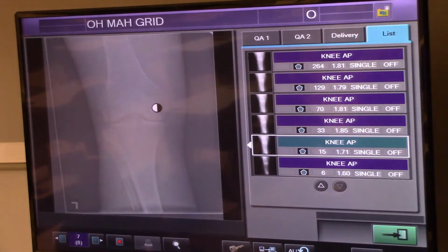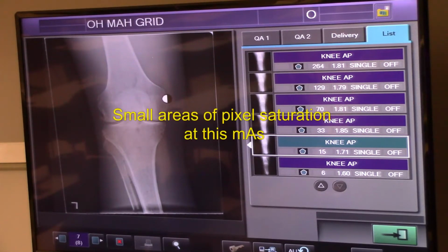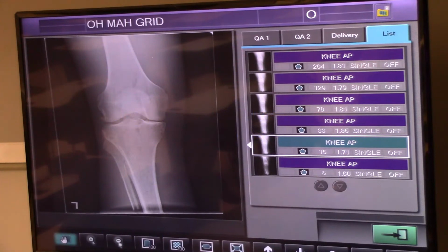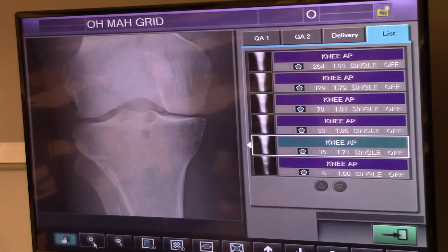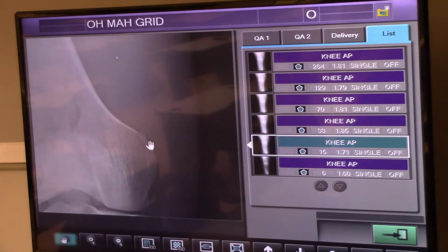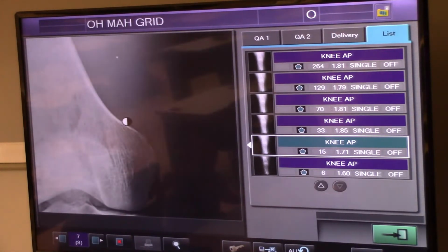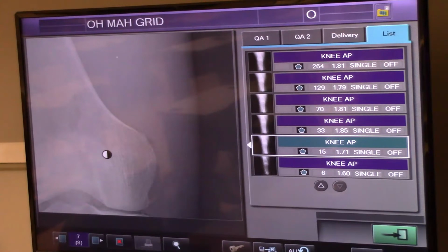I think it is. Okay, the only thing I'm wondering about is 2 areas. Right, you see that little area right there? I think we've got a couple spots of pixel burnout. See that? I don't think we can window width and level that little spot. I think it's just black no matter what we do. Okay, so, oops, we can't show that to a radiologist. They're going to think we've gone crazy.